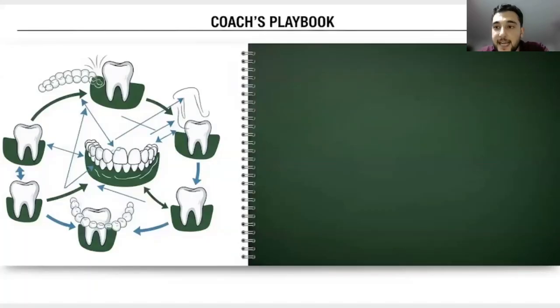So first of all, whenever we get to the video or the 3D simulation of the treatment setup, it's basically the essence of our whole plan for clear aligner treatment. It's the way that we communicate with the technician and the manufacturing, so we can get the plan that we want and we get the results that we want in the clinic. So I like to use this analogy of comparing the doctor to a football coach or any sport. The coach always has a playbook, a plan for the game, and then the players always need to execute the play according to the plan.